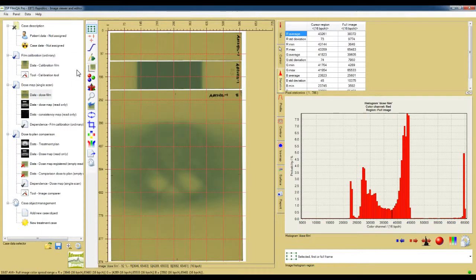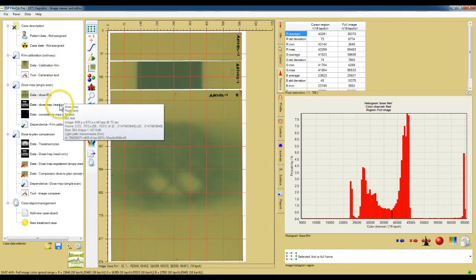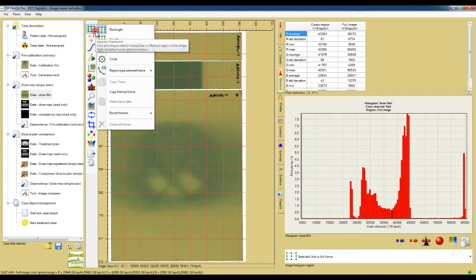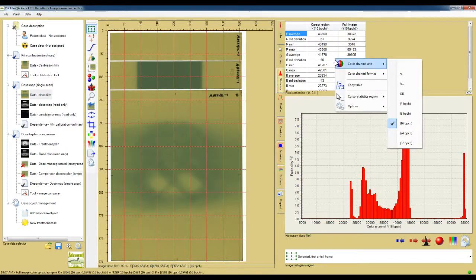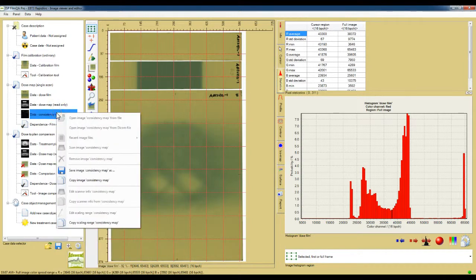FilmQAPro is rich and comprehensive. Hover the cursor over most features and the purpose of an icon or menu item is explained by a tooltip. Click or right-click on any icon, line, image, display chart, table, or other feature, and a pull-out menu or context menu appears with the options. As you gain familiarity with FilmQAPro, you'll soon find right-click is your friend.